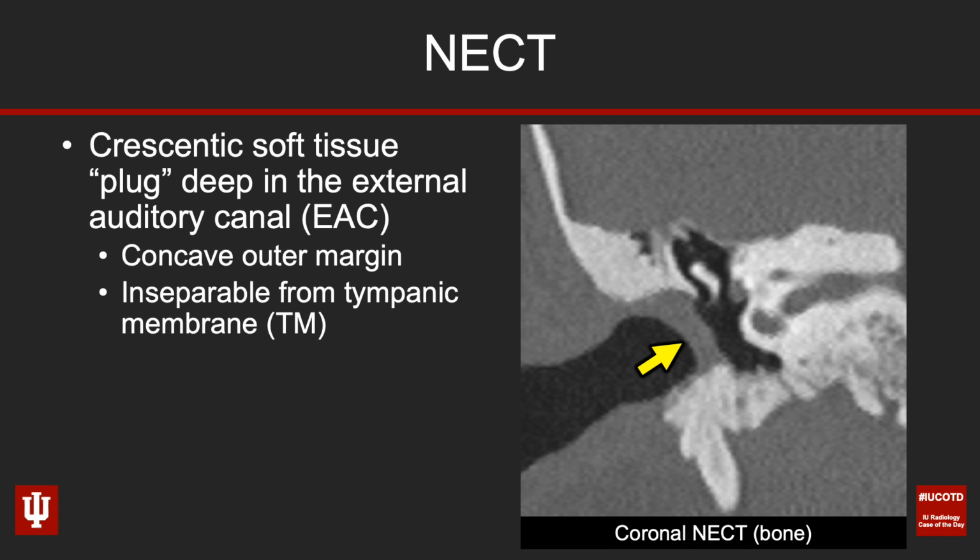Now, as you take a look at this, you can see that the soft tissue plug is really inseparable from the tympanic membrane. In fact, we can't even identify where the tympanic membrane is at, other than we can say with high confidence that this process is not extending into the middle ear. In fact, the middle ear looks completely aerated from what we're seeing here.